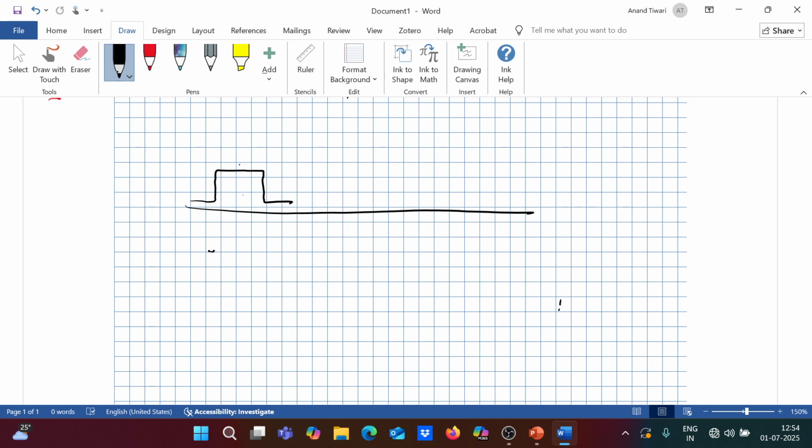Then the other pattern you see is the ascending ramp pattern. This is your descending ramp pattern. This you see in the flow time curve in the pressure control mode. That is a descending ramp. You can see the round pattern. This is the sinusoidal waveform. This you see in the patient with spontaneous breathing.